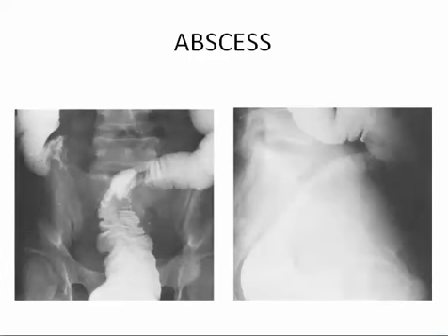A pelvic abscess can produce attenuation of the rectum and rectosigmoid, displacing it against the sacrum, and here you can find some attenuation with coarse mucosa. The coarse mucosa is due to submucosal edema.